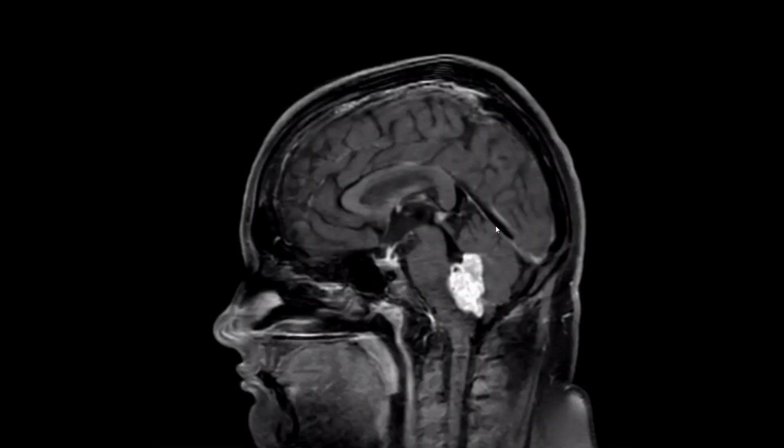What is more logical? I would say ependymoma in this fourth ventricle, and maybe astrocytoma, but less likely in this adult patient. We couldn't say it's a medulloblastoma. Maybe subependymoma, one of the differential diagnoses. What is against subependymoma?